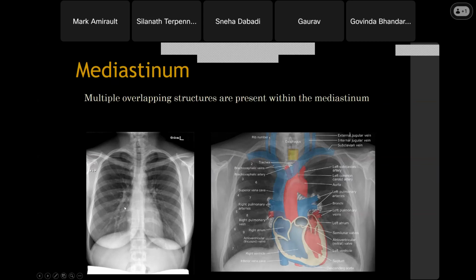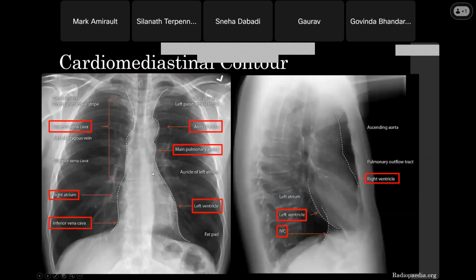If that's obscured, typically things like pneumonia are the cause. It's a border we look for, called the silhouette sign, which you may learn more about later in education. And then of course we have our hilar vessels, by which I mean the pulmonary arteries and the bronchi.